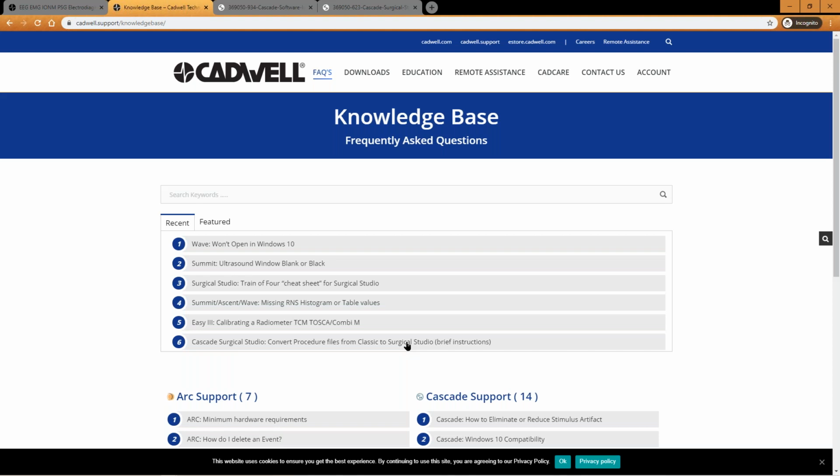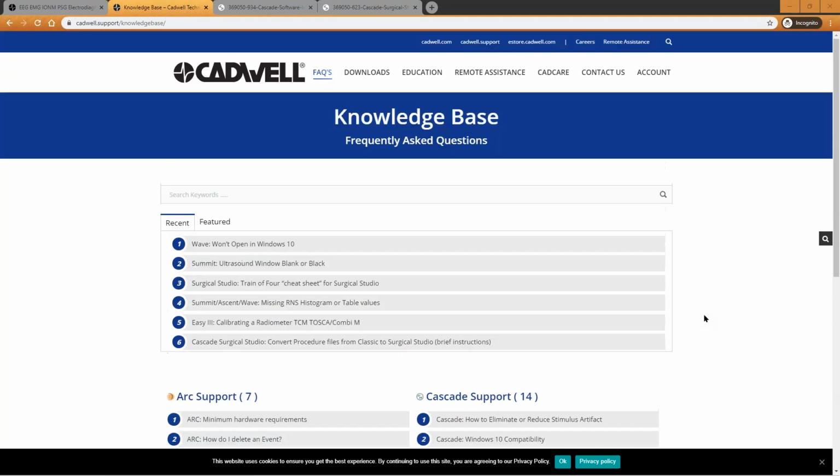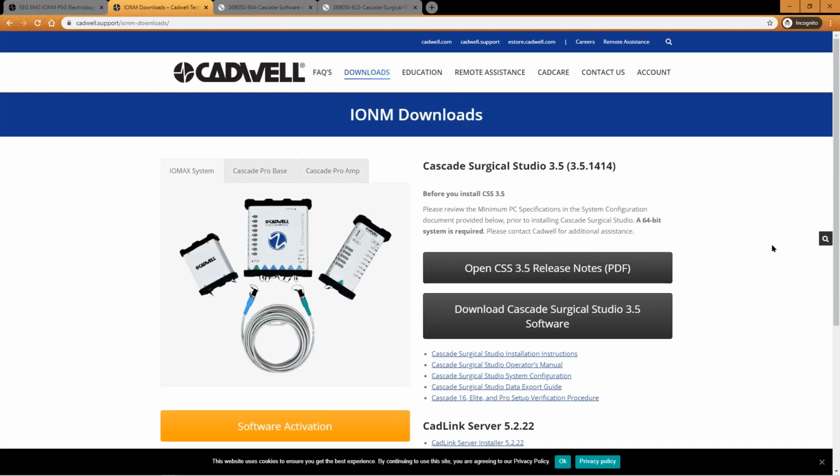Okay, I've now logged into Premium Support. There are some very nice Cascade Support frequently asked questions here, and you can browse those as needed. But the primary thing I want to take you to at this point is the download section. So I hover on downloads, choose IOM downloads, select that. And the first thing at the top here is Cascade Surgical Studio. We always have our latest released version of software on the website. So this is the best way to get it.